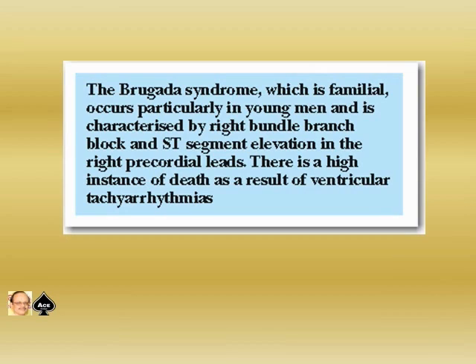The Brugada syndrome, which is familial, occurs particularly in young men and is characterized by right bundle branch block and ST segment elevation in the right precordial leads. There is a high incidence of death as a result of ventricular tachyarrhythmias.